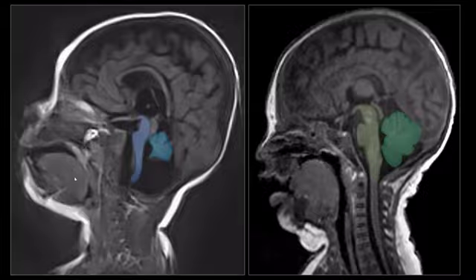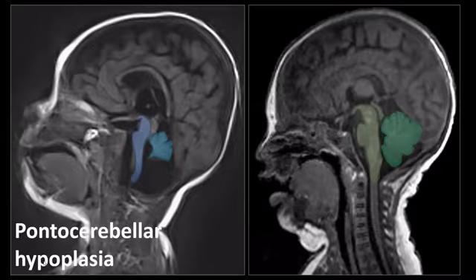So when discussing pediatric cases, I often like to compare it with normal children to better see the pathology. This is the imaging hallmark of a genetic disorder, or basically a group of genetic disorders called pontocerebellar hypoplasia. These are often severe. The diagnosis is often quite clear at birth or after birth that these children have something going on, and they often do not grow old, unfortunately.